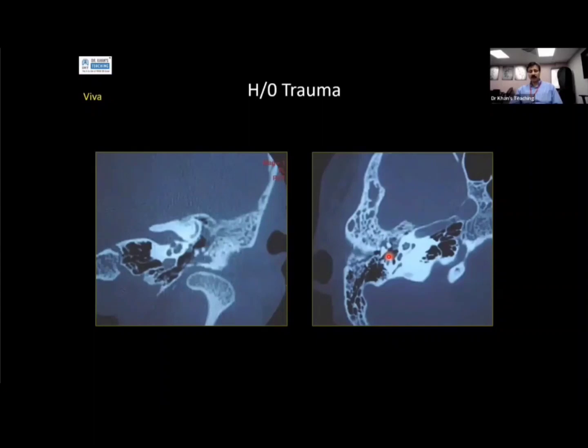Remember that. Though I am showing you a temporal bone study, because these days when you do a spiral CT, it's all 0.625 images. Of course, you have to do reformats then. Another thing is that this is longitudinal fracture. It's not transverse fracture. The concept in temporal bone is, consider the temporal bone as the human body. From here to here is the longitudinal axis. If the fracture is going like this, it is a longitudinal fracture. And if it goes like this, then it's a transverse fracture.